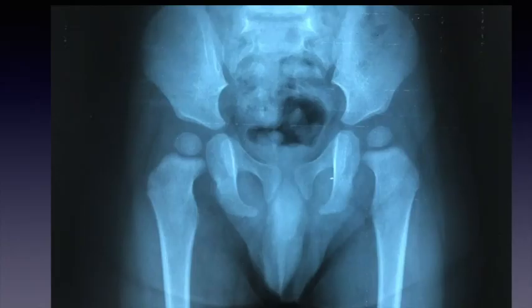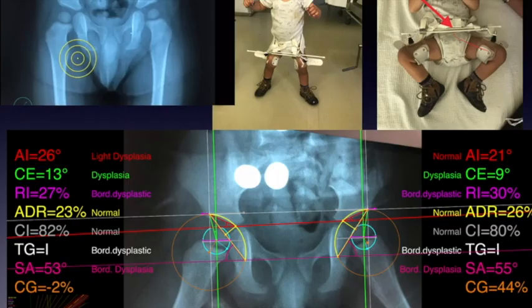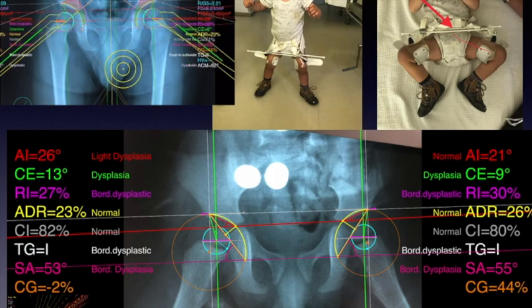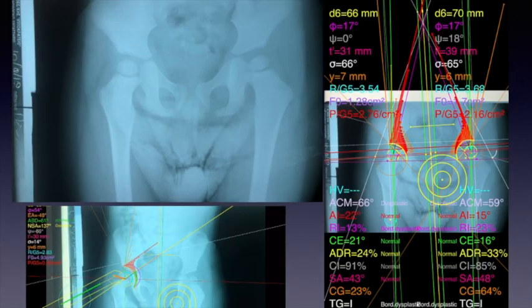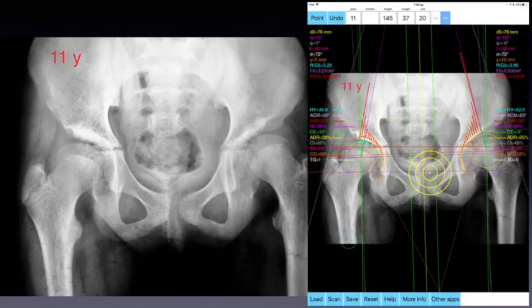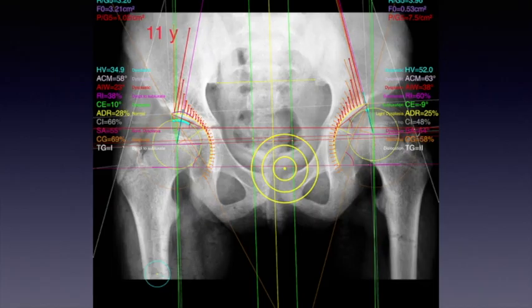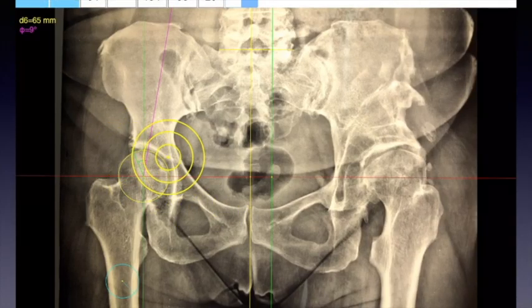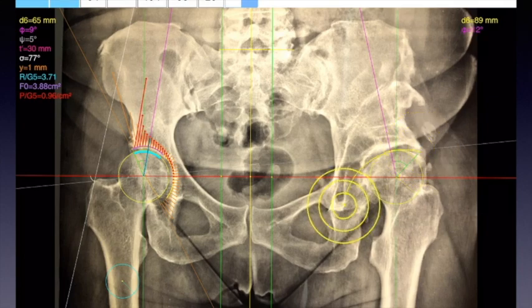The app calculates the 9 above-mentioned indexes in 34 seconds, compared to 30 minutes for manual measurements. The Hip Biomechanics app computes weight-bearing contact surface, the load, R, and stress, P, on the measured hip. Data from load and pressure distribution in the hip, like in real biomechanical tests, are being measured and depicted graphically as vectors over the X-ray and the screen over the joint.